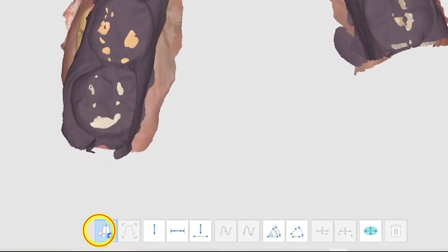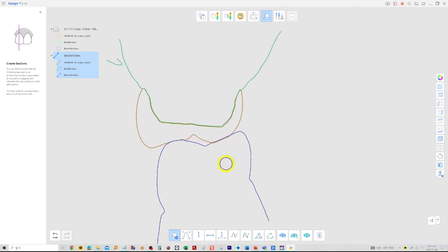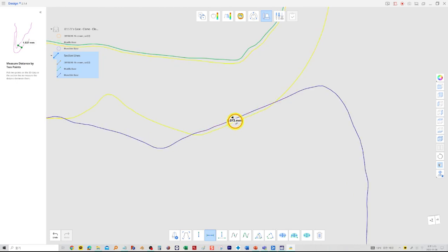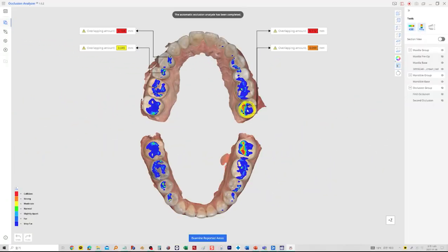Cut a cross-section of the designed crown area. The overlap measurements are 45 and 72 micrometers. This is consistent with the clinical results, which were 48 to 96 micrometers higher. Based on this case, we can conclude that before designing, if a severe overbite is identified that is different from the surrounding teeth, it is recommended that the area be software cut and the bite realigned.